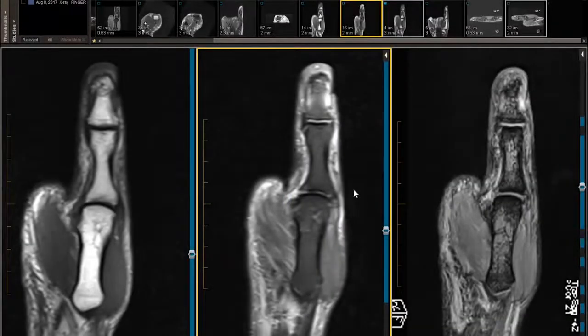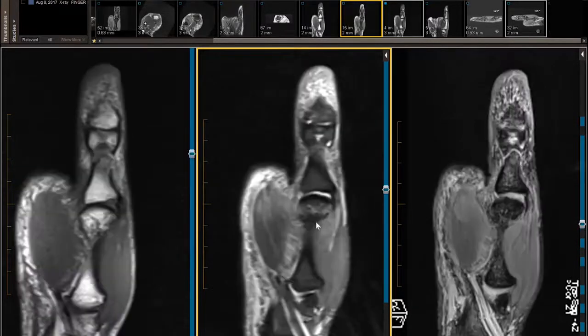Okay, let's take our lines away and look at the signs of an unstable ulnar collateral ligament tear. First sign, the metacarpal is falling off the face of the earth towards your right. Or, in other words, the metacarpal looks like it's drifting eastward. That's an indicator of instability. Next sign, obvious sign, RCL, no discernible, clear-cut UCL.